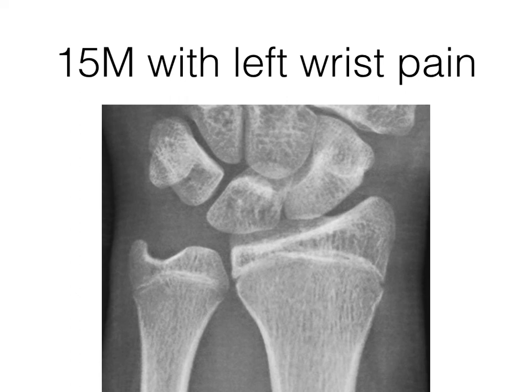Okay, the last case. Train your eye instead of ultrasound. Does anyone see the fracture? The patient was running in school and fell down, landing on the wrist, and then got pain here.